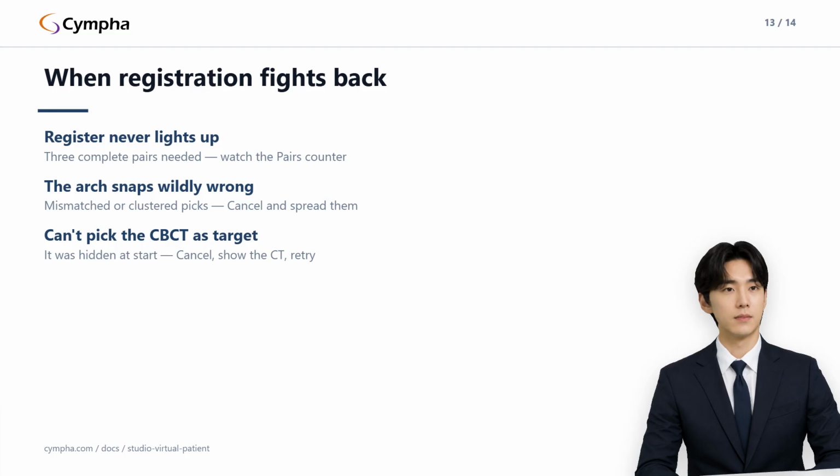Two more to finish. If a texture image didn't bind to your mesh, the cause is UV coordinates, or their absence. STL files don't carry UVs at all, so an STL plus an image will never texture. OBJ files often lack the UVs this pipeline needs, which is why they're unreliable here. PLY with UVs is the format that works, so go back to your scanner and re-export with UVs.